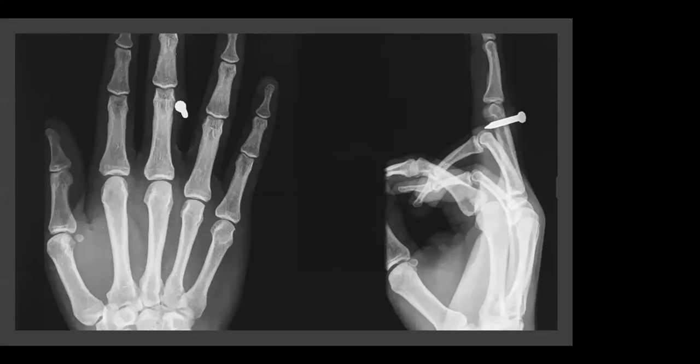But what you're actually looking for is where exactly is the foreign body? Does it go through the bone? Is it intra-articular and goes through the joint? Or is it causing extensive soft tissue damage? Sometimes on the X-ray, the radiographers are very helpful and may place an arrow to indicate where the area of concern is, so for example, the middle finger of the right hand.